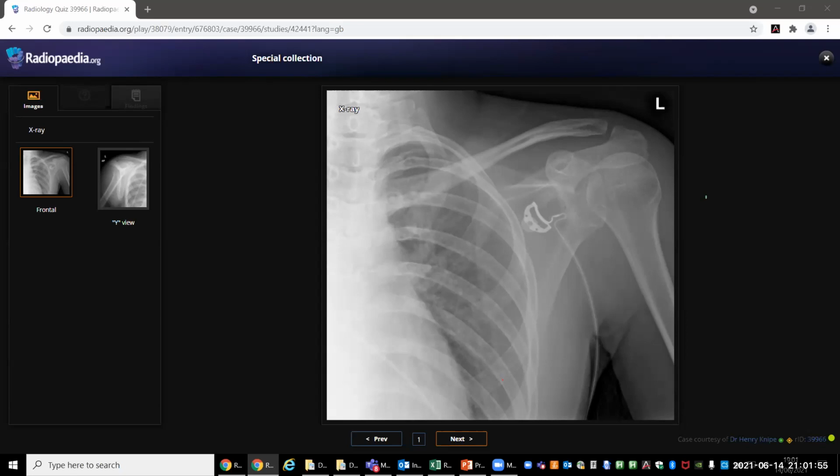I'm looking at the lung field, the left hemithorax. I can't see anything remarkable there, no pneumothorax, no hilar mass, and the heart outline looks normal as much as possible in this view. So my possibility is there is increased sclerosis in the medial side of the left clavicle. It could be osteoblastic metastasis. Okay, that's right.